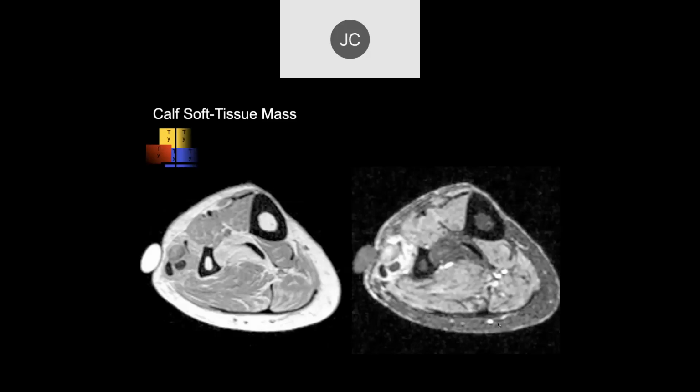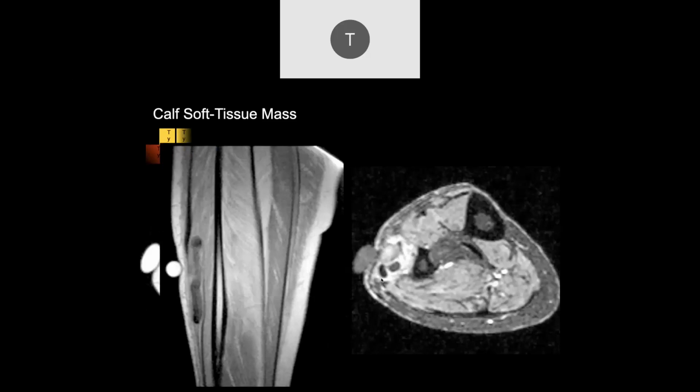So there's peroneal tendons I see, but there's a low or heterogeneous structure anterior to it. Is that just a severely tendinotic tendon? Okay, and we've got edema around it. Let me show you some other images. This is a coronal image. Retracted tendon? Okay. So this looks like there's some rope that's balled up in the calf here near the distal musculotendinous junction.